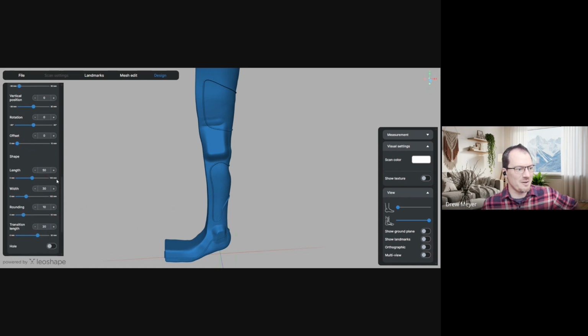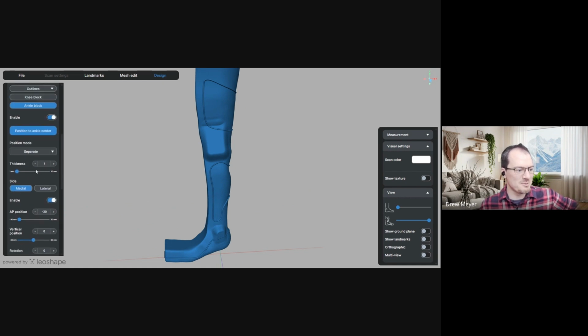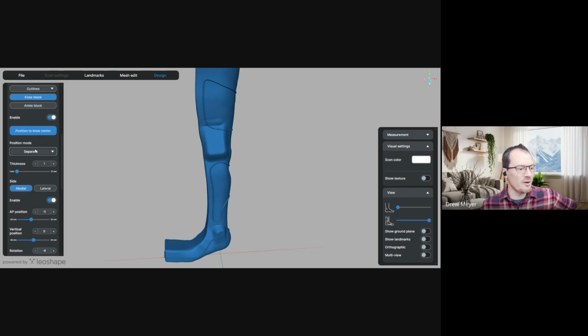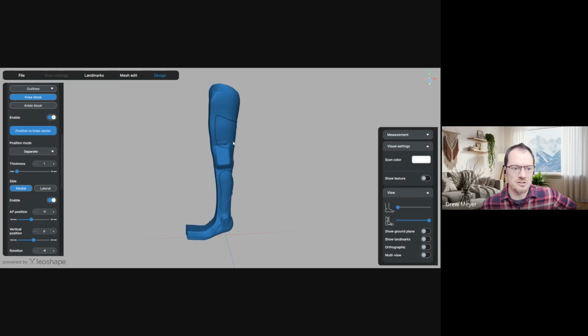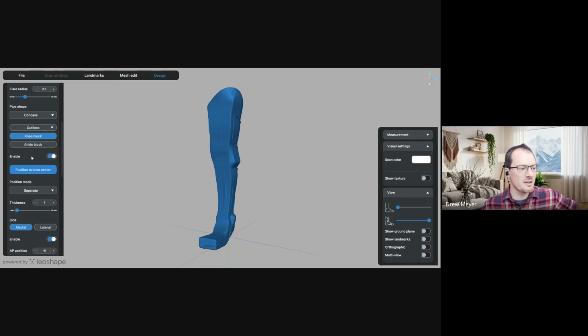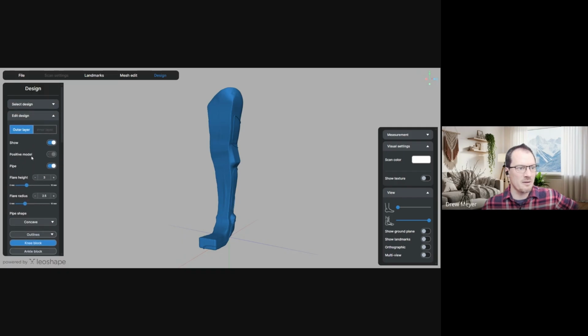This is a little rough. I'd need to spend a little bit more time with it, but I just wanted to show you what that looks like for the purposes of adding these new features to the KAFO beta version here. So if you are interested in trying out this beta version, please let me know.